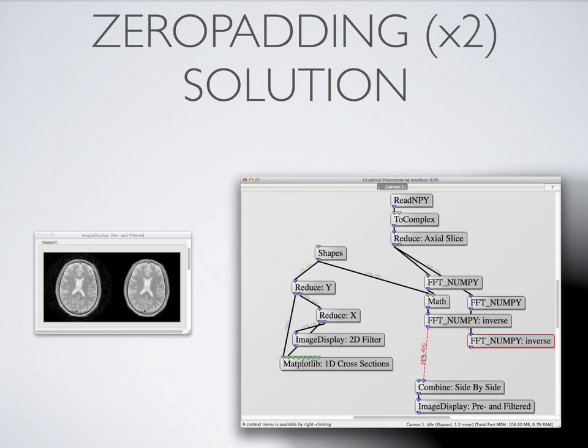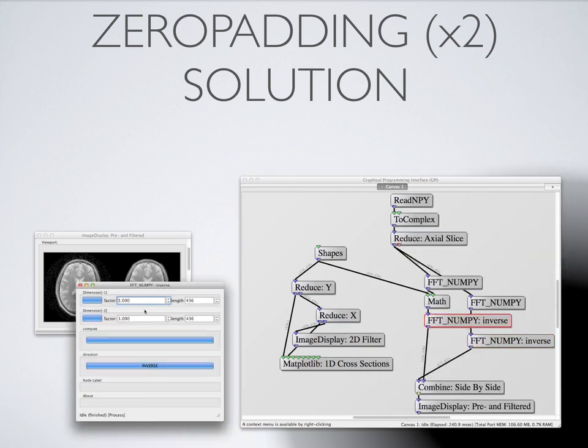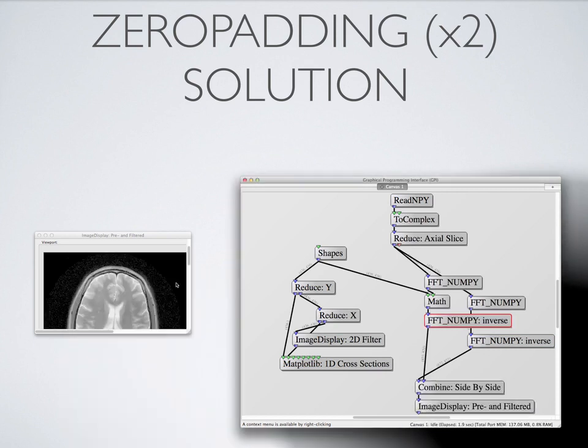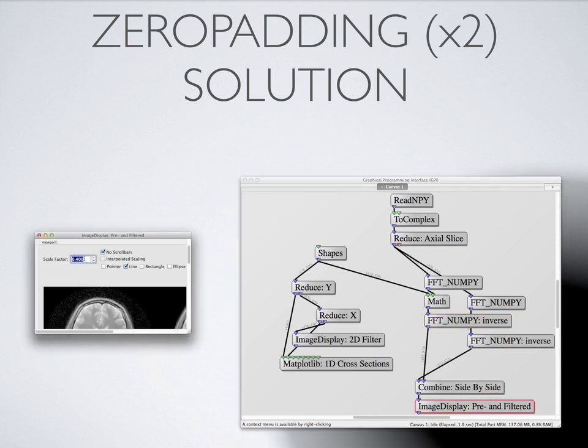When they're both sent to combine, the output port turns yellow, indicating that nothing changed. This is because combine can't concatenate 2 arrays along a dimension with differing lengths. To fix this, the filtered image is padded by a factor of 2 in each dimension, and the images are scaled. We can fit both in the window by resizing the image.